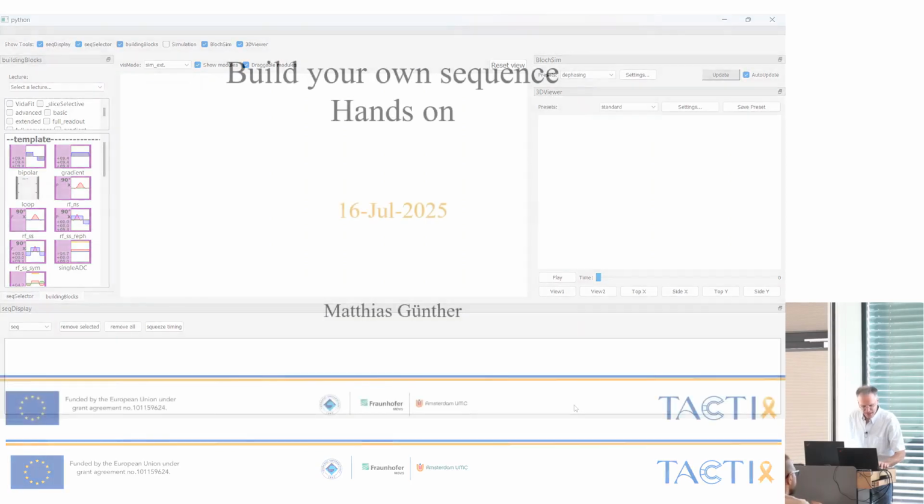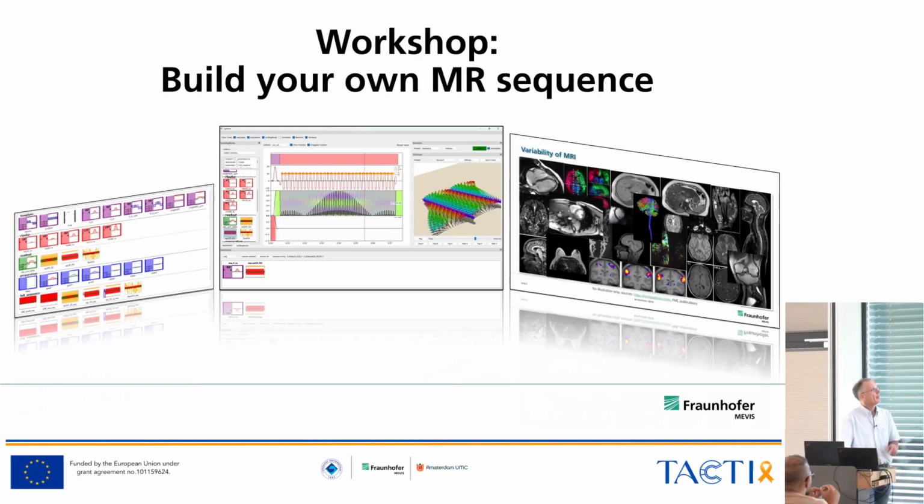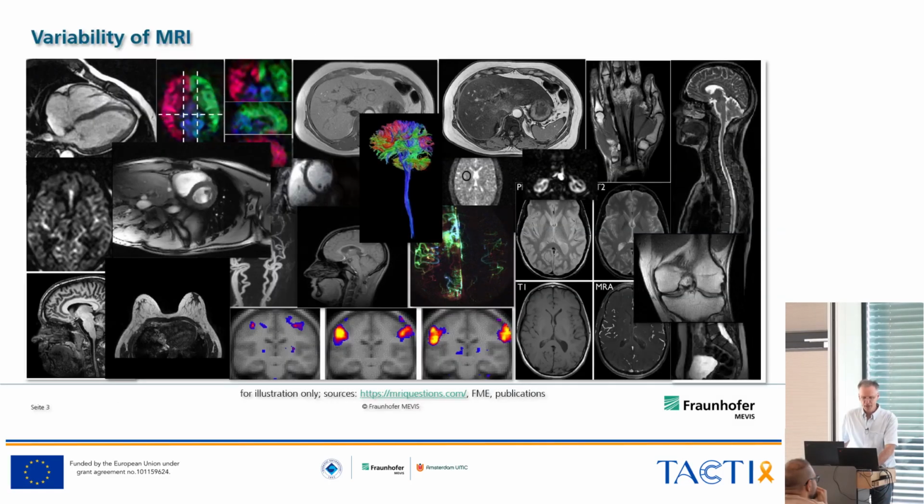Yeah, so the idea of this session is to start to build your own sequences and play around with, and just use different building blocks which I prepared to get your maybe first experience in writing MR sequences. All of them could run on a clinical scanner as well, but that's not the topic of today's session.